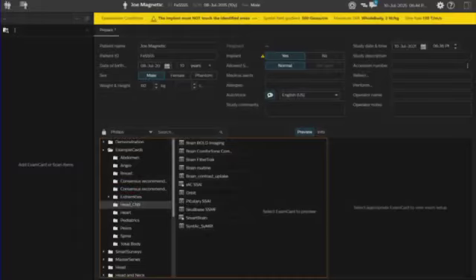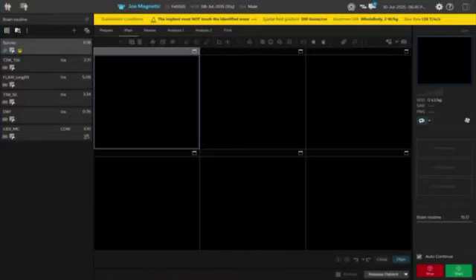When you go to the next step, you'll see that there's this yellow toolbar at the top of the screen. That is just indicating that you have put these limitations in. When I select a protocol, say a head brain routine, and click Next, I actually can see my sequences are loaded. I still have that yellow toolbar. And even if I add a sequence to this protocol, I cannot exceed those values. It's adjusted automatically.